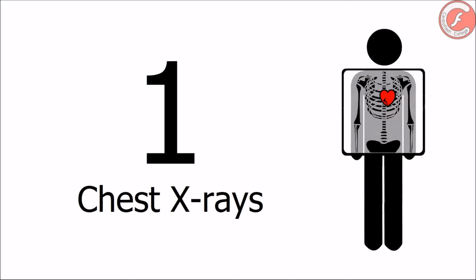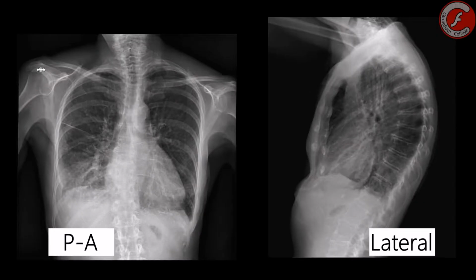Number 1. As you know, the chest X-ray can give us relevant information in patients with certain cardiopathies, such as mitral insufficiency. In this way, a severe mitral insufficiency can produce, radiologically speaking, an increase of the heart shape because the dilation of the heart cavities is a frequent phenomenon of the disease.